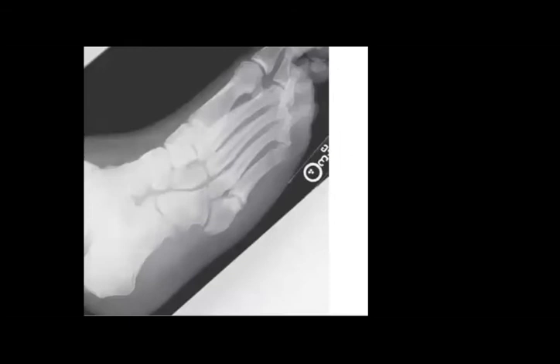This one is for you after the training, I think now it will be very easy for you. Jones fracture, fifth metatarsal fracture, perfect. Transverse fracture through the junction of the diaphysis and metaphysis of the fifth metatarsal, what is called Jones fracture, and it has non-union here because the edges are sclerotic. Okay.